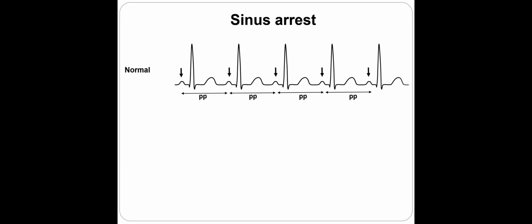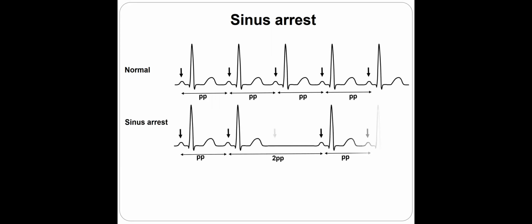Almost, okay. Now let's see another thing that is called sinus arrest. That's a normal one. And what does sinus arrest mean? When the sinus does not fire when it should fire. Exactly this interval, this absence right here, is exactly twice as long as the normal PP interval.